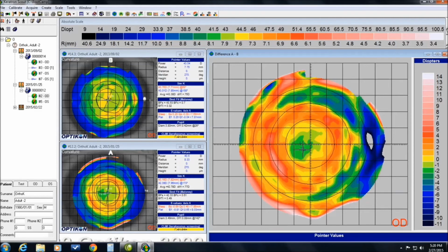And you can see that I've flattened this pretty significantly out in the middle, but in the margin of the pupil out here, I still have some plus power. I've got some red that's kind of leaking into the pupil, trying to give her a little bit of near vision even without her lenses on at all. But we got a good centered treatment, nice and symmetrical, and I was happy with that one-day result, and so was the patient. Let's look at the left eye too.